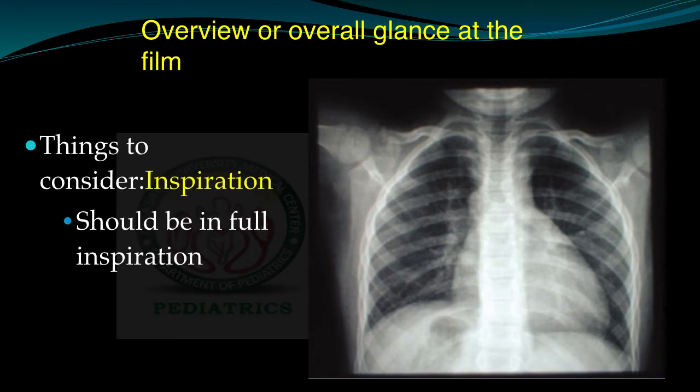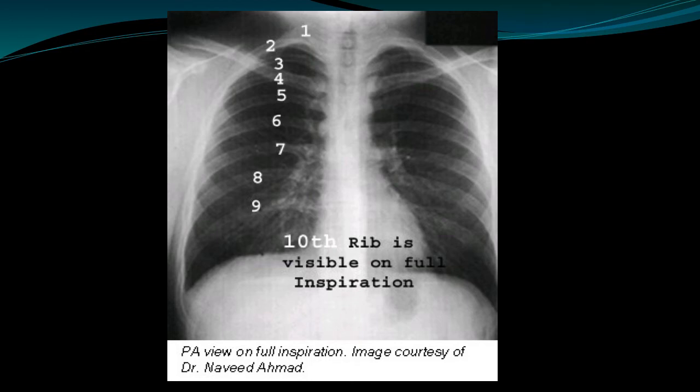Things to consider. Always remember that the chest x-ray is taken on full inspiration. So in other words, it is acquired in the inspiratory phase of the respiratory cycle. So the radiographer asks the patient to breathe in and hold your breath. And always remember that the patients who are short of breath or those who are unable to follow the instruction may find this difficult.